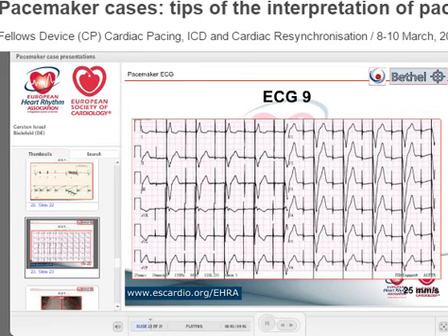No, because it would mean atrial oversensing, one atrial spike must be missing. And you see even from the very last seat, atrial pacing is extremely regular, no gap. Any undersensing, P wave with pacing after it? No. So atrial, no problem.